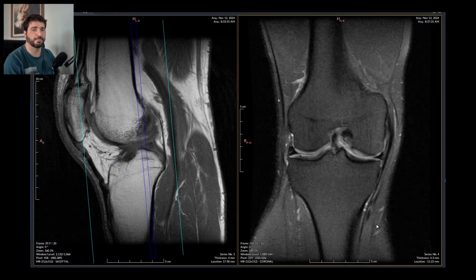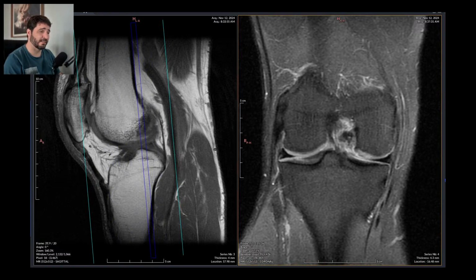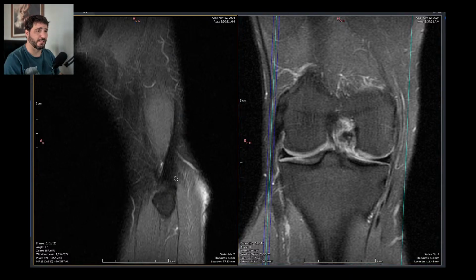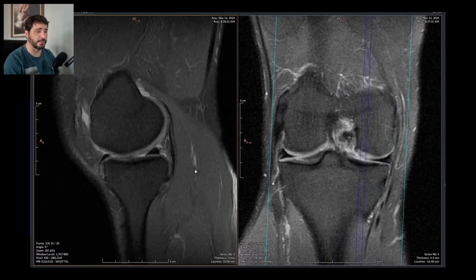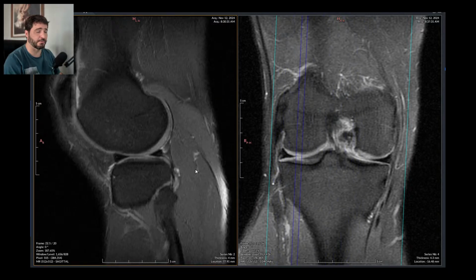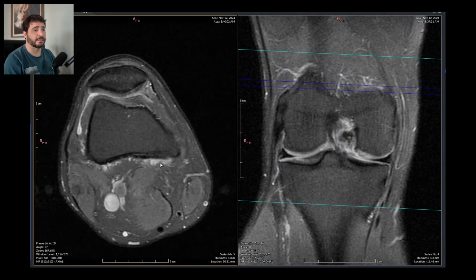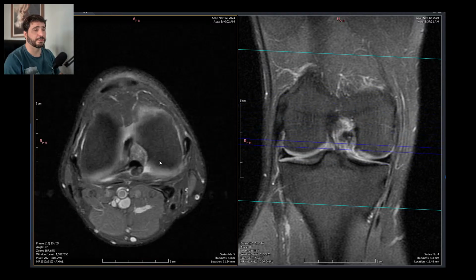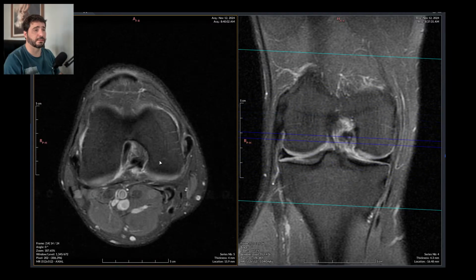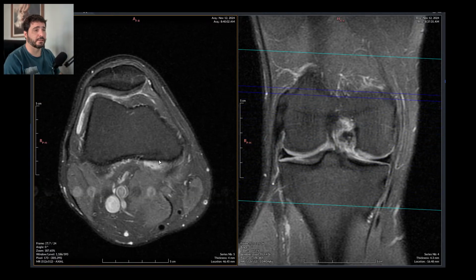This really isn't supposed to show much because it's too thick. It's just one of those scans that only show gross disease. It doesn't show small disease, doesn't show tiny features of disease, just low quality, low cost scans.